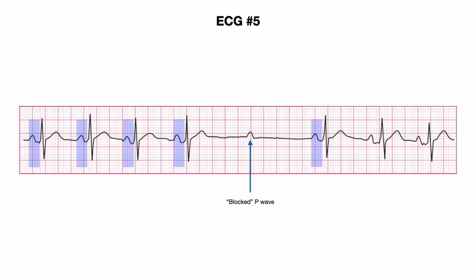However, there is evidence of slowing of the sinus rate. The green intervals on top represent the intervals between the P waves. You can see a clear increase in the PP interval before the block. The diagnosis of Mobitz type 2 second-degree AV block cannot be made in the presence of variable slowing of the sinus rate. The heart rate must be constant. This ECG is consistent with increased vagal tone and is relatively benign.